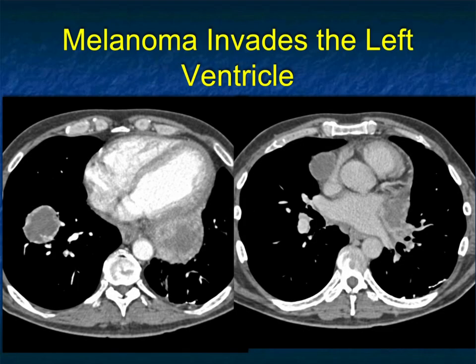This was melanoma. If you said this was lung cancer with implants, I would have considered that as a possibility. If you mentioned lymphoma, I would have a hard time arguing. But again, melanoma is something you need to think about. Melanoma is more frequent these days. Any of the skin-related tumors are more frequent.